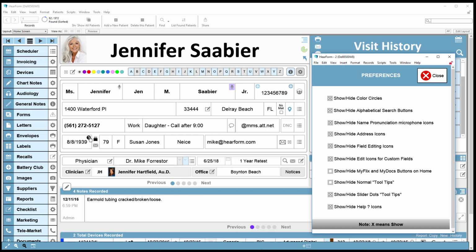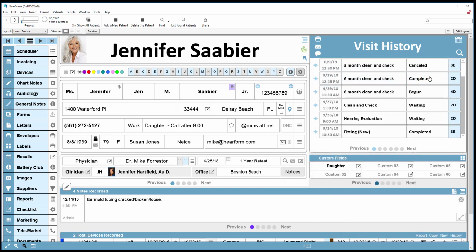You'll also have some written text that might help as well. But again, after you learn the program, no need to have a bunch of question marks all over the place, so we'll uncheck that. So for now, I'm just going to go ahead and close that window, and we'll continue on with the rest of the Section A.